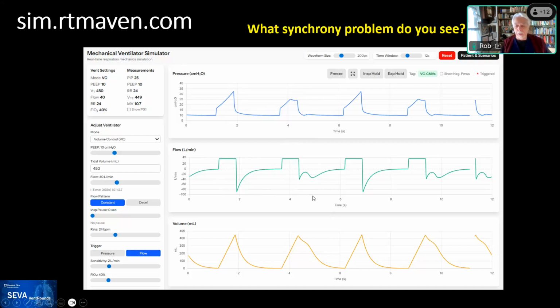Did anybody come up with a reason, Eduardo? Yep. What you got? There's a PMUS present, early cycle, and then an early trigger. You may want to differentiate those two as you go through.